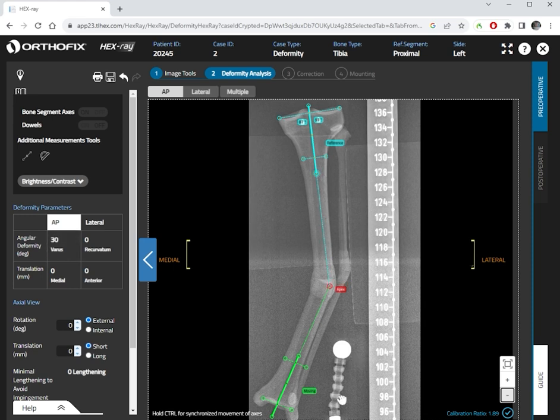Yeah, so for whatever reason, when we use the joint lines, need to be more accurate because we knew this bone is 30 degrees. But really, it doesn't matter. These are a few degrees, it doesn't matter. You can use a shaft or you can use a joint line. In the middle of the bone, shaft will be easier. But if the deformity is closer to the tibia, the proximal joint or distal joint, you have to use the joint orientation line. Okay, so I'm happy with that.